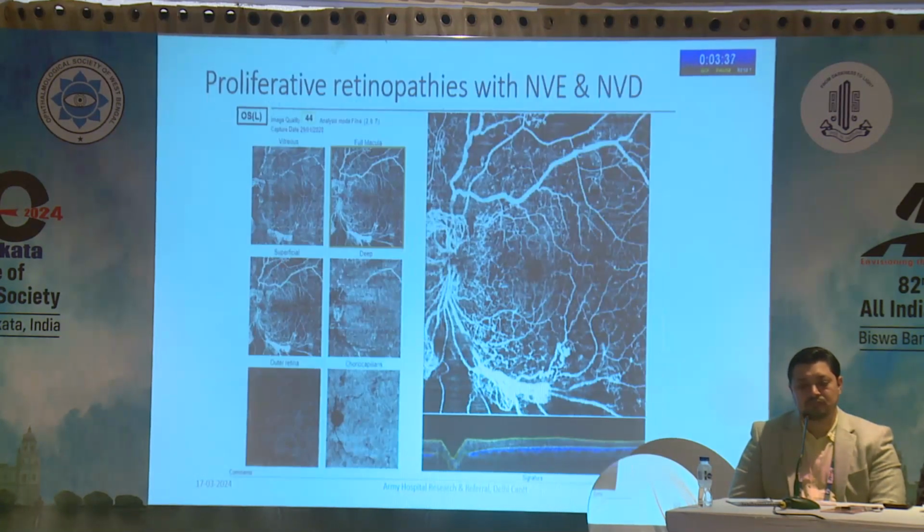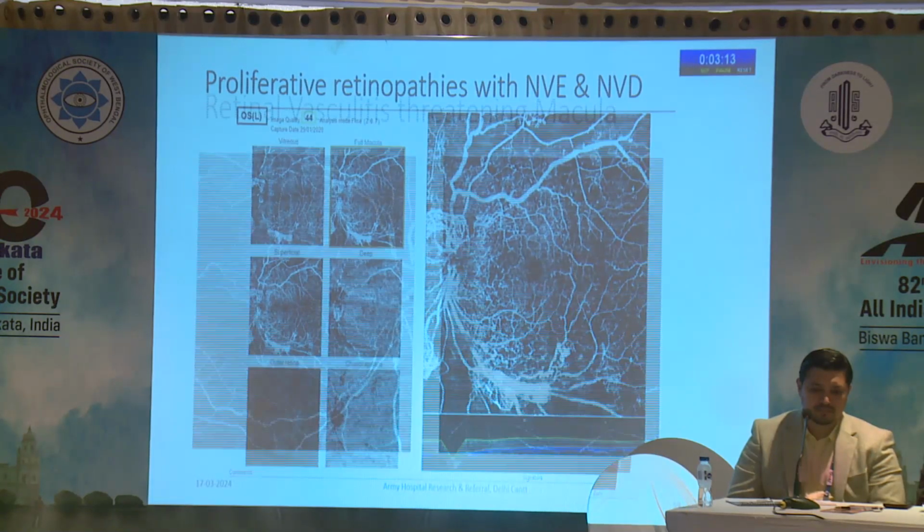Similarly, you can see cases of proliferative diabetic retinopathy also, as sir had beautifully shown that if you do segmentation, you are even able to pick up these NVEs most of the time. So this is an evolving method of diagnosis with better software coming in. Very soon we will be able to pick up all these NVEs without having to resort to fluorescein angiography.